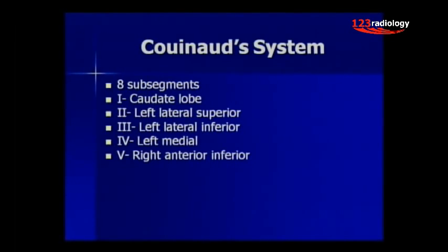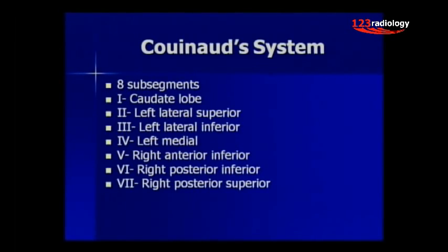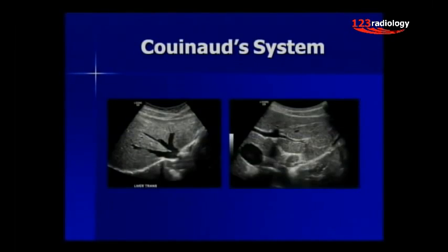5 is anterior inferior, right. 6 is right posterior inferior. 7, right posterior superior. And 8, right anterior superior.